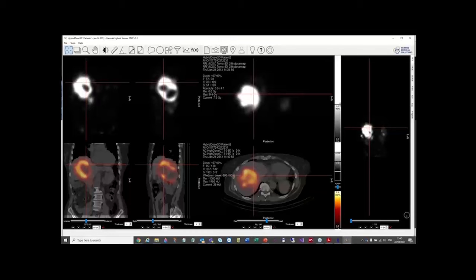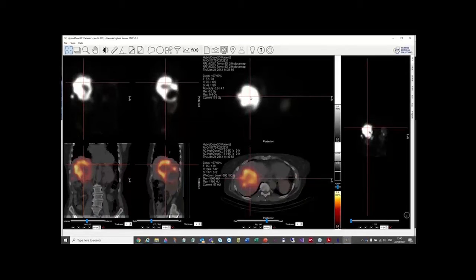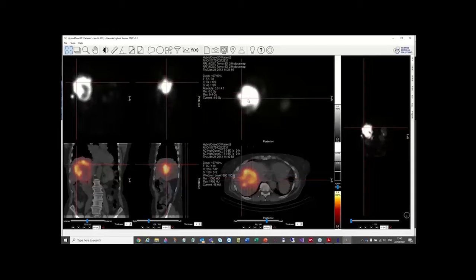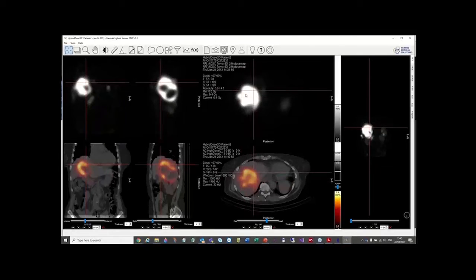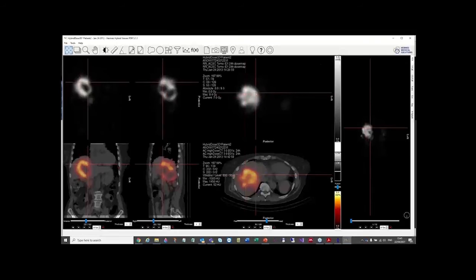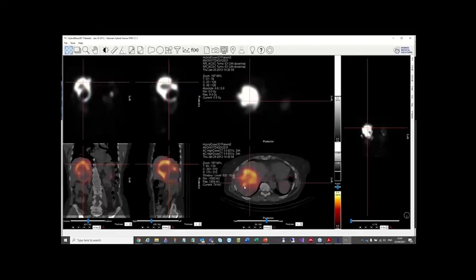Okay, so here is the dose map itself. We're looking here at the hybrid viewer fusion again that's showing this until Affinity can deal with it. So we're looking at a gray in every voxel now. As I'm clicking around, hopefully you can see these small numbers changing here. The window level is also specified in gray. So we've got 9.4 gray at the top, and then as I window down, we can see the levels of gray. So the absorbed dose in each of these voxels is represented directly here in the image.